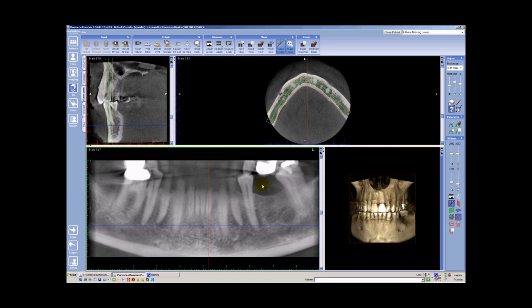Now we're not quite done yet in orientating our data, prepping it for the next stage of implant planning. If we were to measure for an implant in this region right here, we would most likely want to measure on an angle from here to here. However, if we were to do a cross-sectional slice of this right now, we would end up measuring from here down to here because this is the straight parallel. So basically, this blue line, which is the axial slice plane, all cross-sectional slices would be taken perpendicular to this blue line. So how do we remedy this situation?